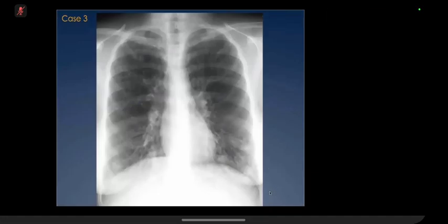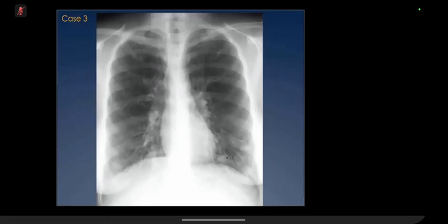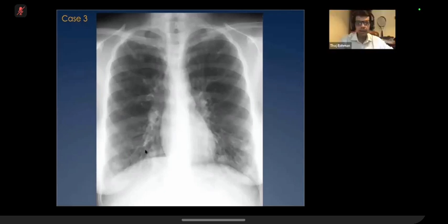Okay, so I can see bronchiectatic changes, predominantly lower zone. Tram track sign. Can you see the tram track sign? Yes, bilateral. So that is the tram track sign. Get your eyes used to seeing tram track signs, which are quite diagnostic.